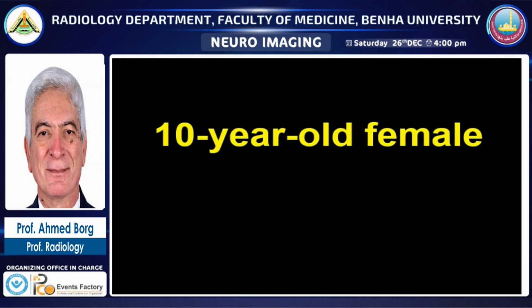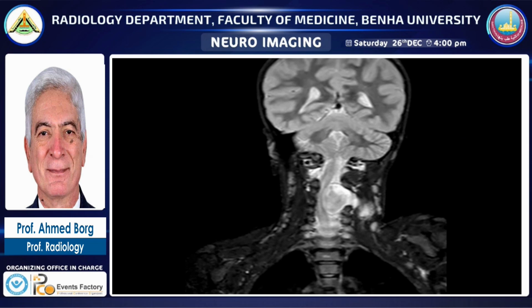10-year-old female. There is a mass here inside the spinal canal with a large extraspinal component also, and displacement of the spinal cord.